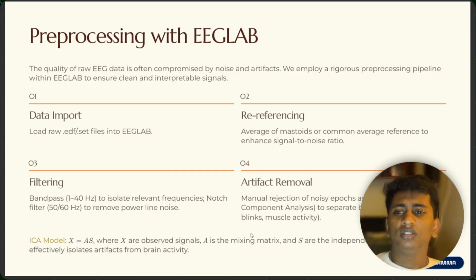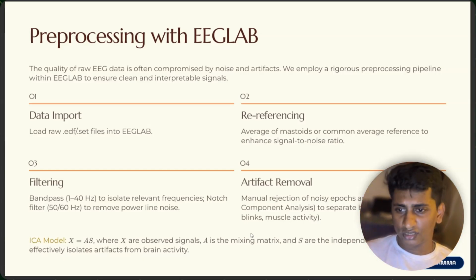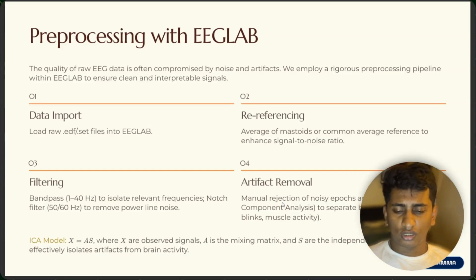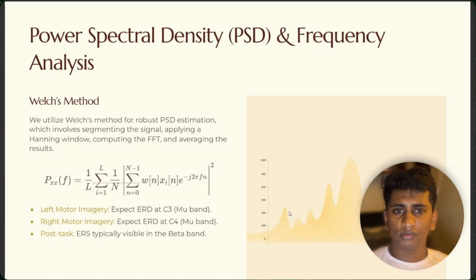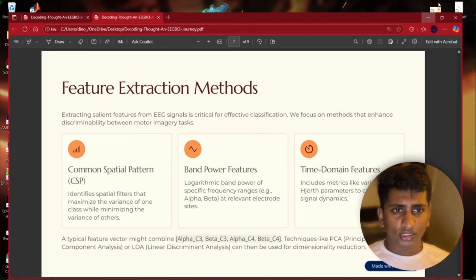So this processing I'll be showing. We'll import the data, do re-referencing, filtering, and artifact removal and all. I'll be showing it to you. There's the power spectrum, and these are a few parameters. So I think we'll go to the main thing. Just a second.